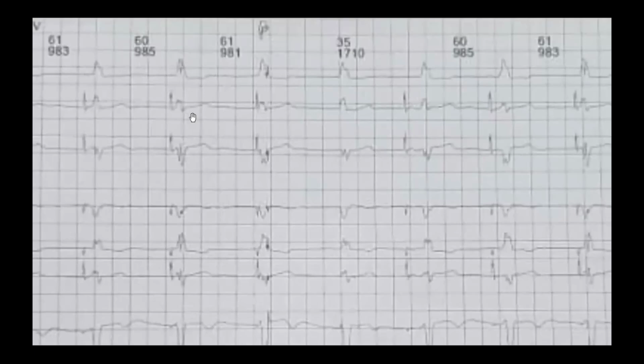No, unfortunately. But we can notice here that there is ventricular safety pacing also. Ventricular safety pacing here and atrial pacing here. Here, no atrial pacing as this is considered as a PVC. The junction is considered as a PVC, which resets timing. Here maybe conducted atrial pacing and resensing.